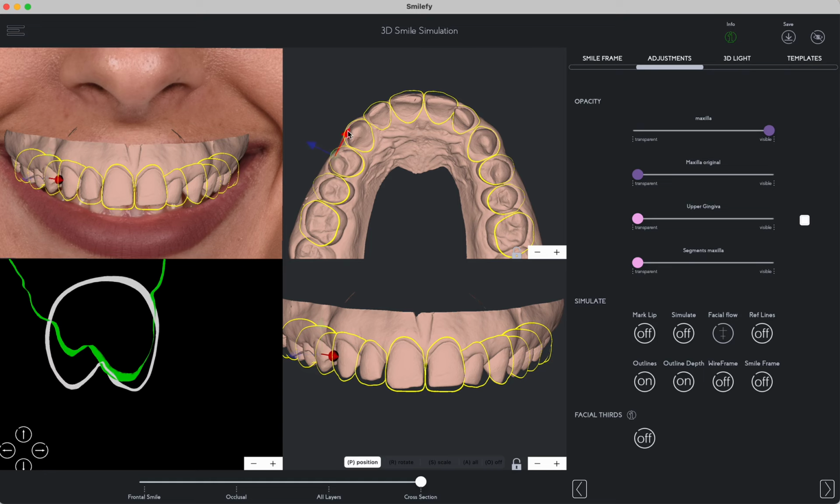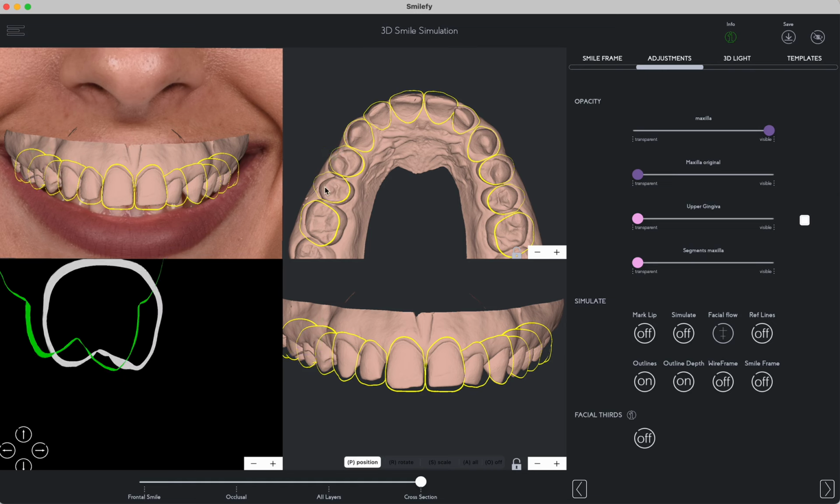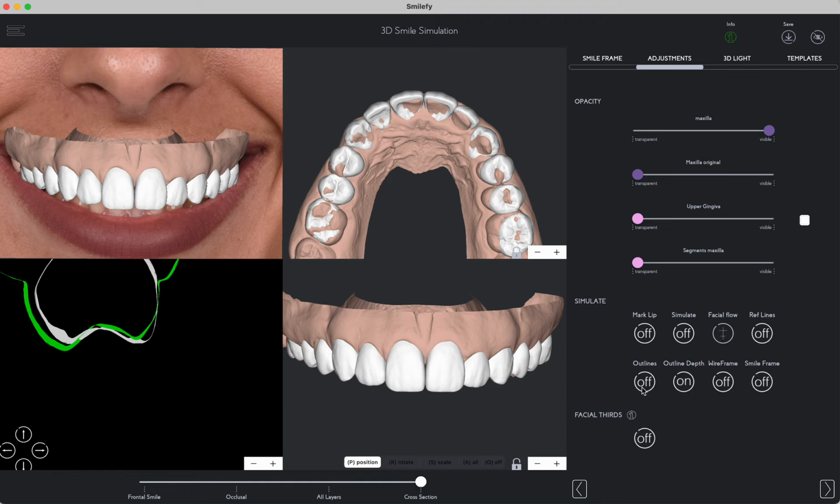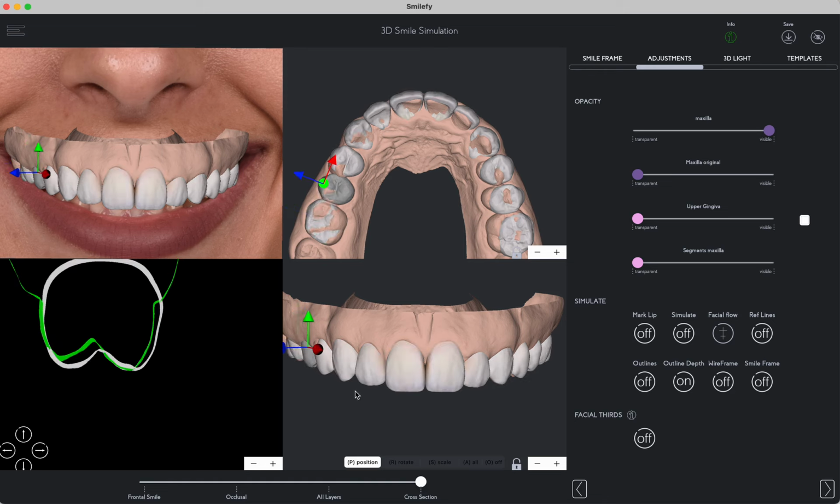It's the ideal design, so I know that's the way I want to have the teeth in the final stage. After ortho, you see the premolar is very, very rotated, needs to be corrected, and then I make the space here for the rest of my teeth. I see here the incisal edges, so look how easy I designed the right side of the patient. I can change the view, and now I have the ideal design for my patient with all the corrections and all the issues that I want to resolve to get to the perfect smile for my patient.